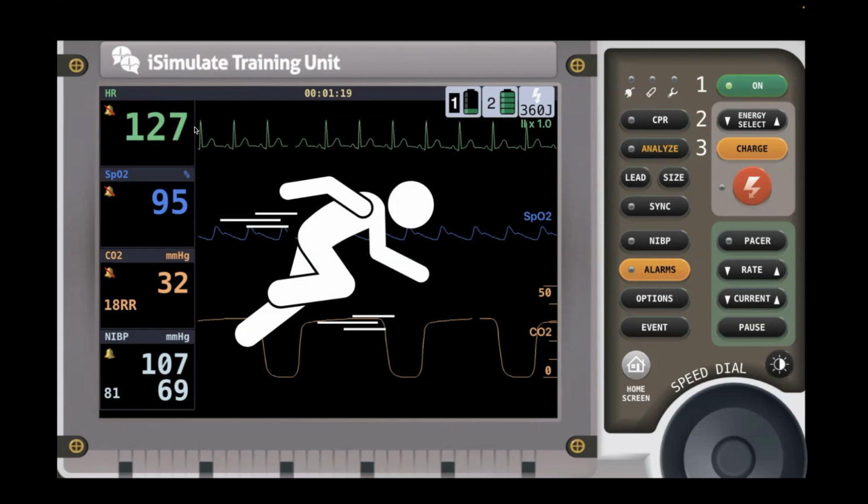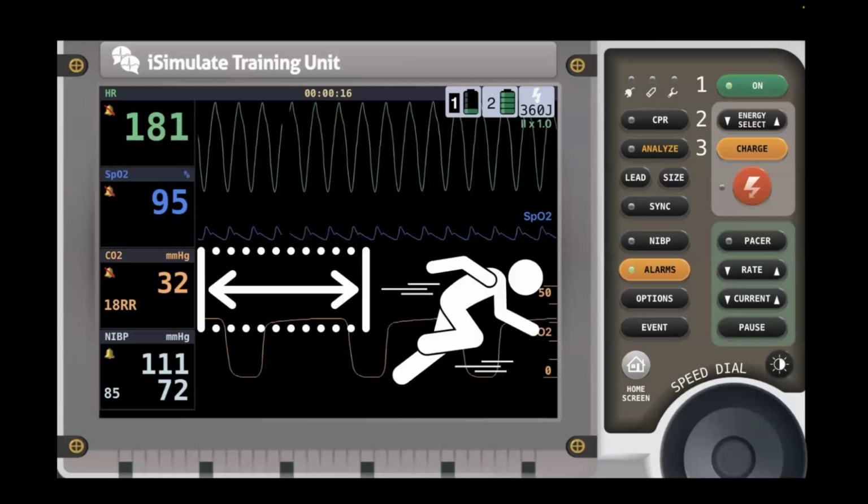But what we want to let somebody know is this fast heart rate. That's a really fast heart rate for a patient sitting down as you're hooking them up to the monitor. This would be the heart rate you would see on a treadmill, running, or exerting yourself. Somebody shouldn't be just sitting there hanging out with a heart rate of 127. So our first "hey, check this out" is a tachycardia, 120s plus. That would be a showstopper of, "Can you look over here at this real quick for me?" But again, P wave for every QRS, narrow QRS coming from the top: sinus tachycardia.